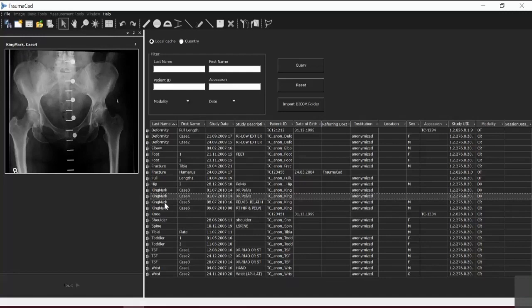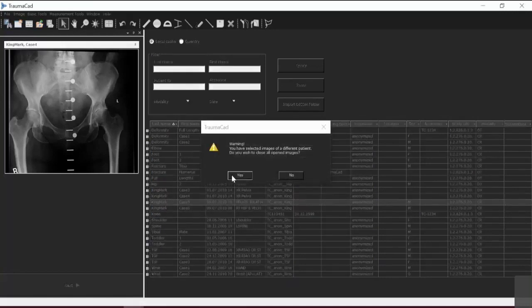Can you use a 3D CT model? Yeah, that's a very good question. So let's go to a case and let's just use a case where we may want to do some more analysis around the pelvis. So let's go to this case. I'll just pick any case.